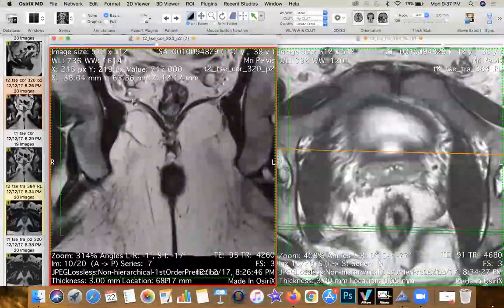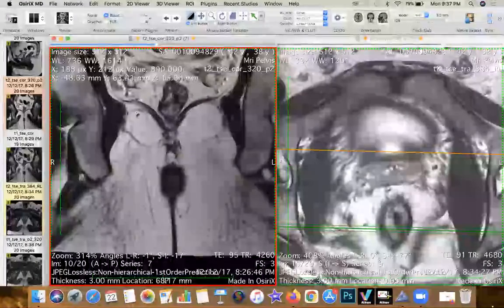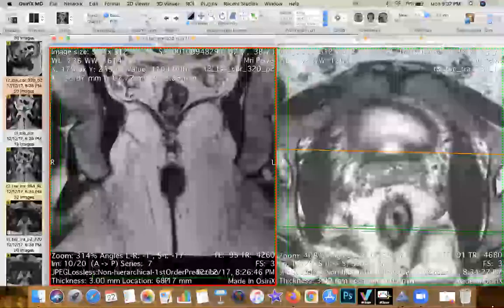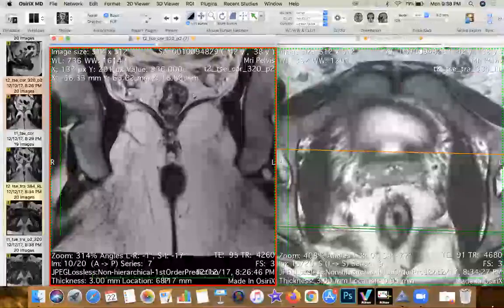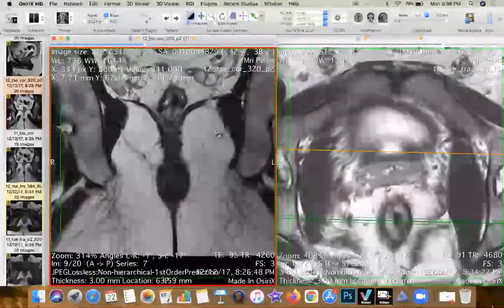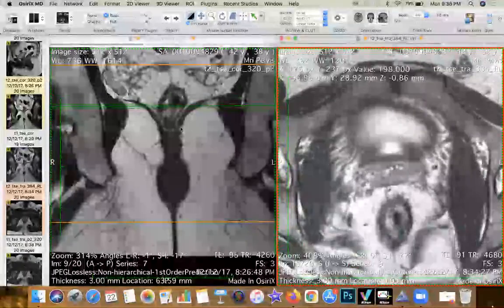This is a very important structure. You would see a seagull appearance. The disruption of this structure out here usually leads to defects in the levator ani, and therefore you may get pelvic floor abnormalities or pelvic diaphragm abnormalities, which could be unilateral or bilateral. So it's very important to identify this fascial continuity very, very well. That's basically talking about the two major muscles, the pubococcygeus and iliococcygeus.